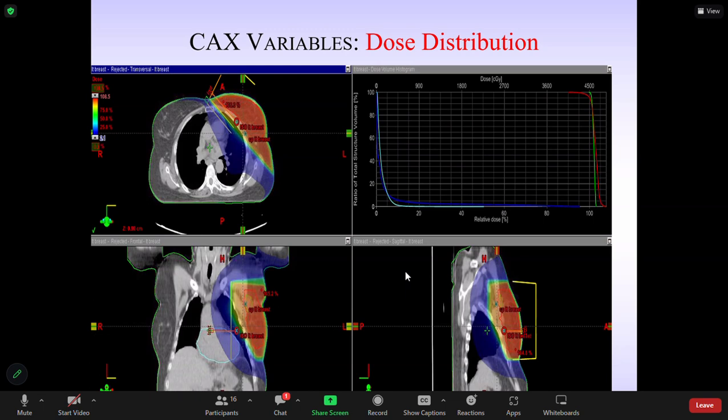Half of the beam is blocked, but obviously we need to put the isocenter in a way that is right. And the other thing is the calc point, the calculation point, because that is the one you're going to normalize, what I was showing you. Okay, and that's one way of evaluating a plan.